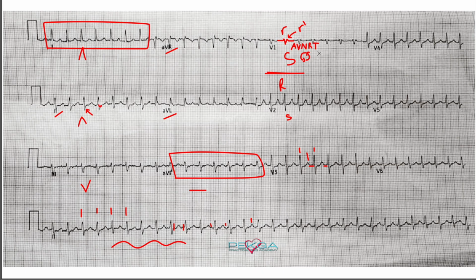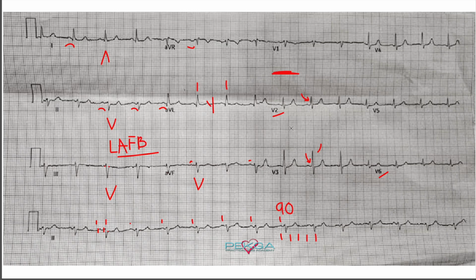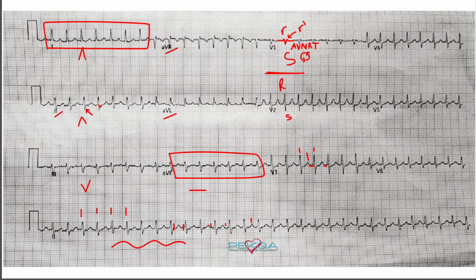Does that matter in this case? No. Would this matter in long-term treatment, if this person wanted to get rid of this? Absolutely. And this is exactly what perhaps an electrophysiology study might reveal, or maybe an ECG caught at a proper time, where you could deduce, just based on the ECG, where the accessory pathway is located. Okay, so let's see if I'm forgetting anything on here. I think not. So let's recap here.